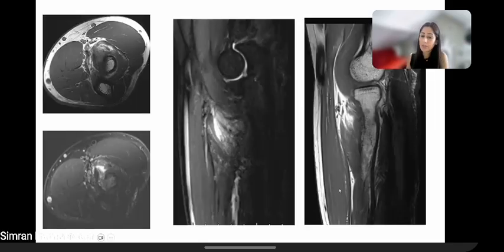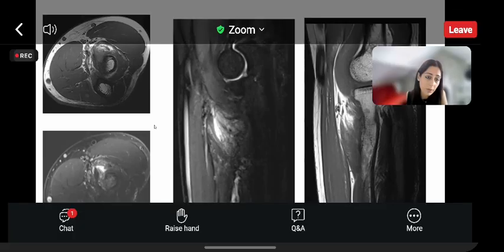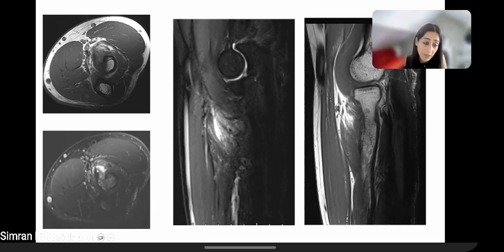And on the MRI, I'm sorry, the images aren't really great in this one, but just see, there is the abnormality centered at the radial tuberosity. You have the distal biceps tendon, which is really thickened, and there is a lot of fluid. There's a lot of inflammation in the bicipitoradial bursa. And all this on the sagittals is your new bone formation.